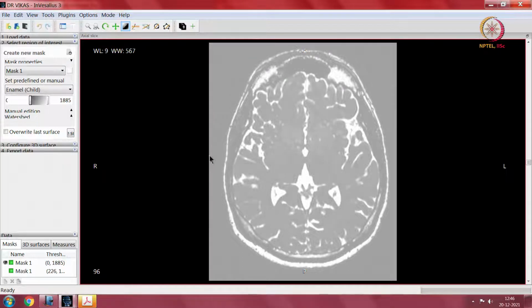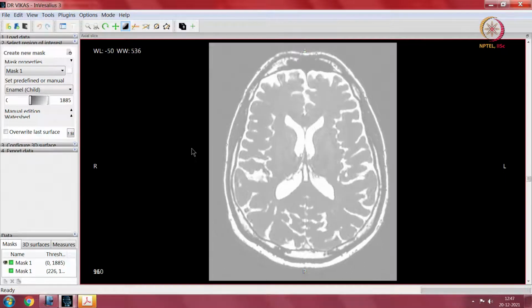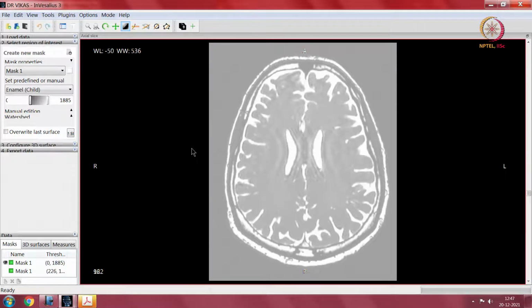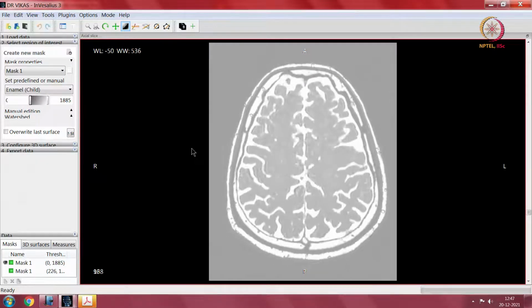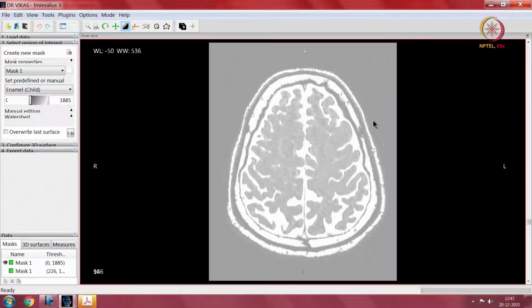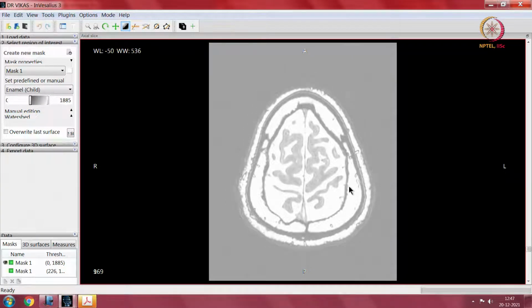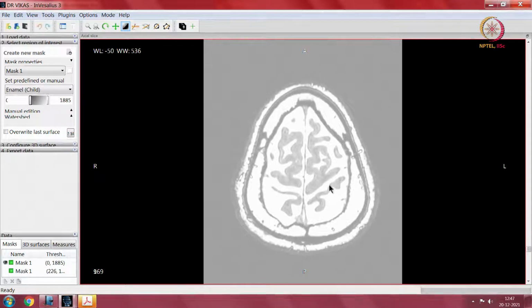If you recollect from my earlier discussion, I spoke a lot about the structural anatomy without delving into the gyri and sulci. Nothing of that discussion was there. That is being described over here, and we will see how best to make use of this image in understanding the gyri and sulci. Gyri and sulci are now very obvious. You can see so many gyri over here, and each depression is called a sulcus, and there are so many sulci around here. How do we make sense of an image like this and try to map the 3D knowledge which we acquired earlier onto this?